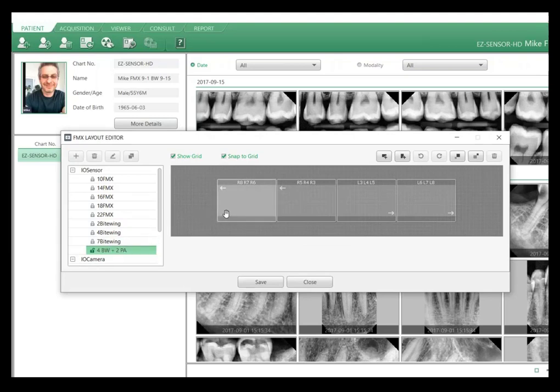So now when we navigate over to our grid window, we're just gonna move these boxes around, or these layout spots for the sensors. So we can just grab these and move these. So I'm gonna drag these all to the sides to make way for our 2 PAs in the middle. And also we have this snap to grid option selected, which makes it easy, and it puts it right next to the other image.